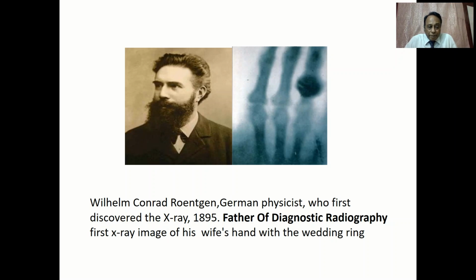Can you see the first image? Actually, this is the image of his wife's hand with a wedding ring.